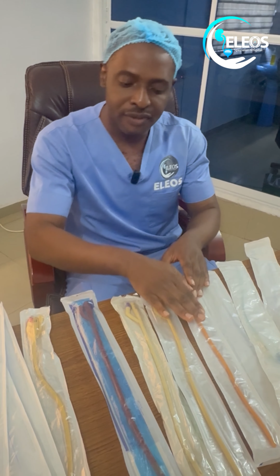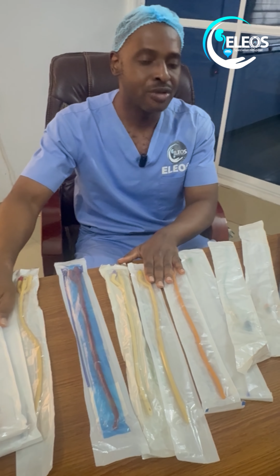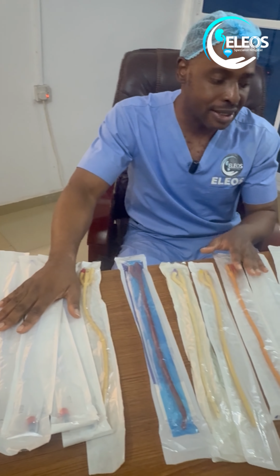Like I talked about, you have the latex catheters, you have the silicone catheters. You need to know these things. Latex catheters are there, silicone catheters are there, and we usually prefer silicone catheters to latex catheters generally.